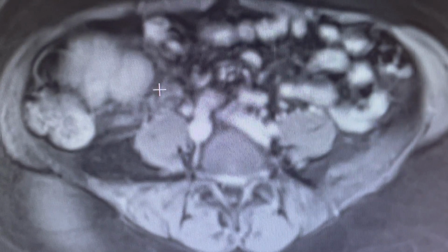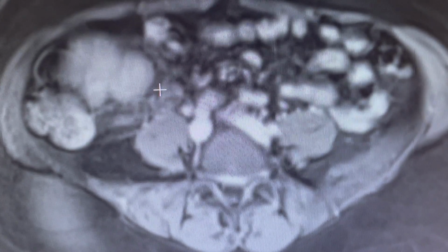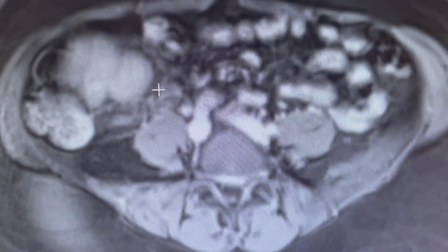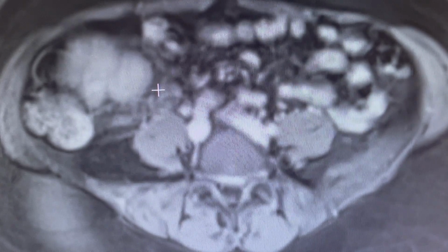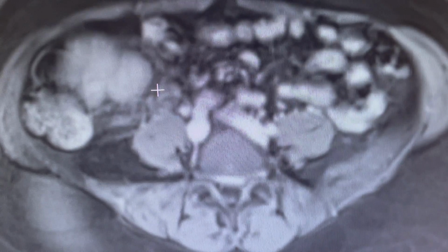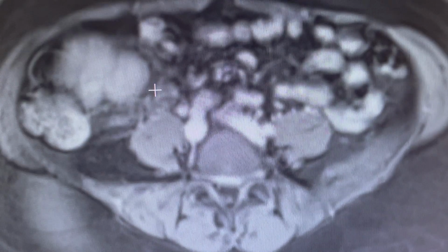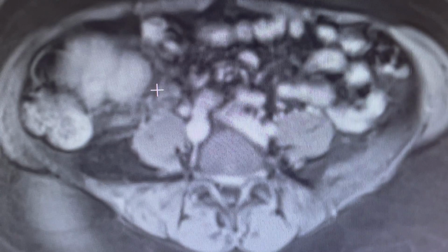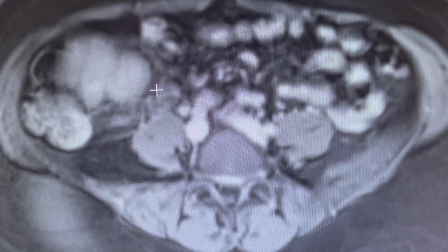Now, hypervascular metastases generally show intense arterial enhancement like these, show high signal intensity on T2 weighted images like these, but they show either fading to background liver or at times washout, which is getting darker than liver, which these did not show. These showed retention of contrast. The smaller ones showed fading to background.